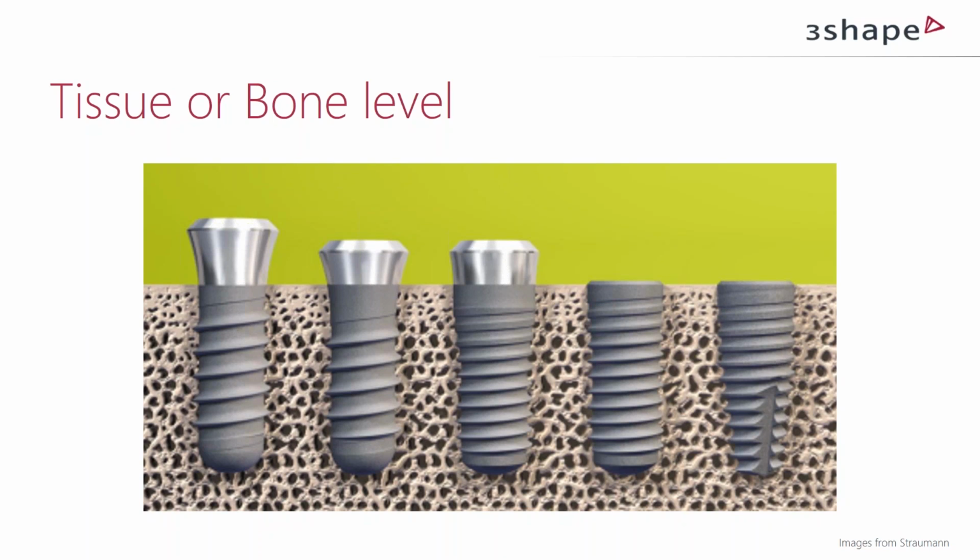So placing an implant that actually penetrates the soft tissue already directly after surgery is to prefer. But in the front, where we need good aesthetics, where we need to cover the implant and get a nice emergence profile from the implant and up, we see more bone level implants. So there's actually a distinction on where in the mouth the implants are placed.